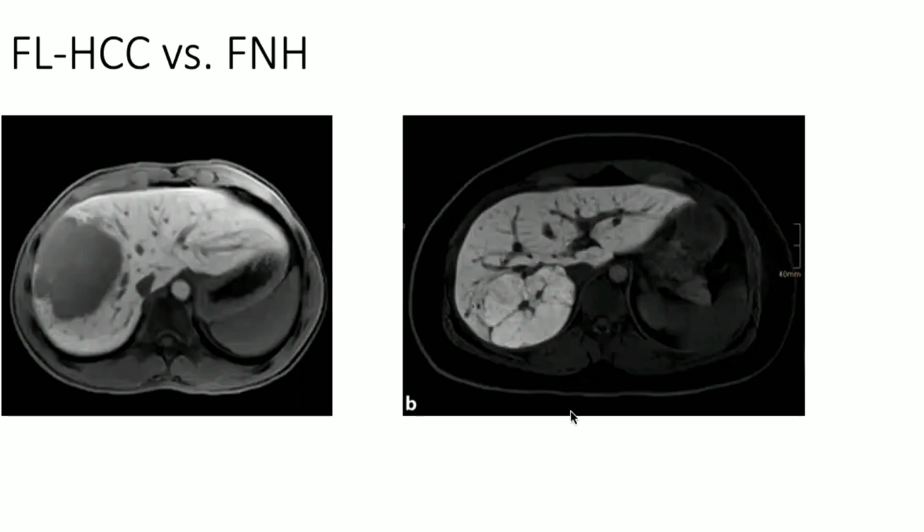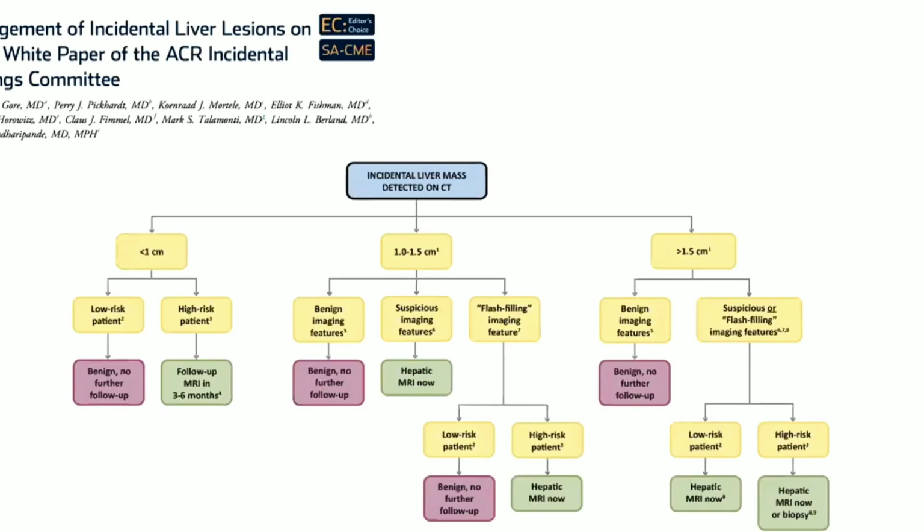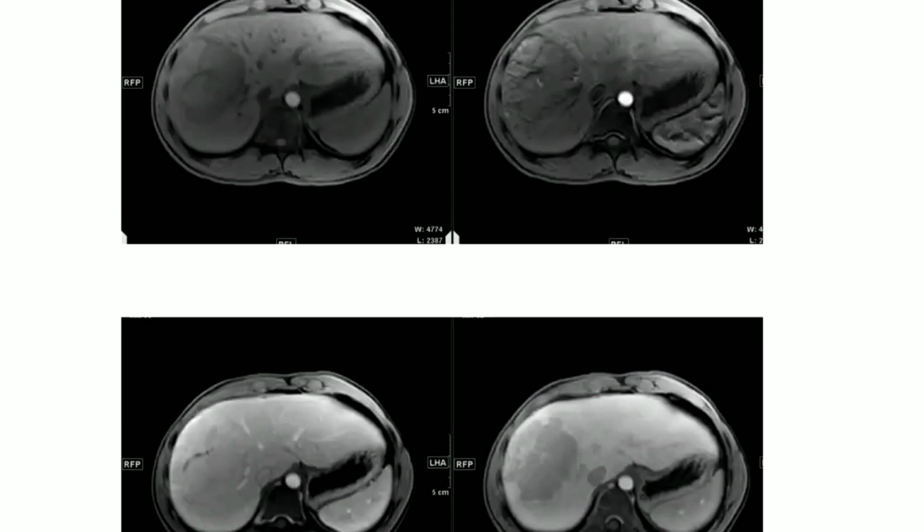There is a question regarding this case, ma'am. Yes. What about the T2 hyperintense scar? And why is the scar showing delayed enhancement? So, as we know, not every case reads the book classically. So they say that the scar in fibrolamellar HCC is actually a fibrous scar. So a fibrous scar still might enhance in the delayed phase. So it's not always seen.